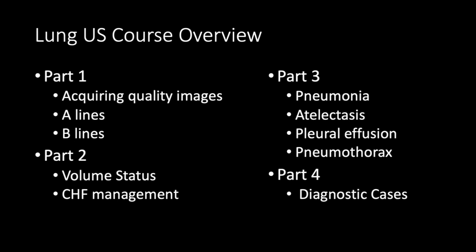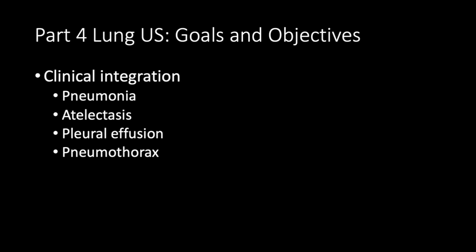Now finally in part 4, I wanted to go over some diagnostic cases in which we review those 4 pathologies. Specifically, I want to work on clinical integration today and make sure that you feel comfortable using ultrasound and incorporating it into your clinical decision making in these real life cases.